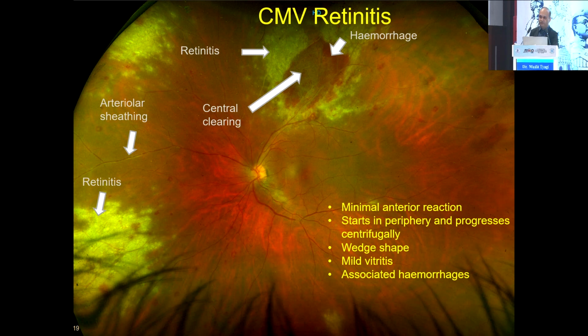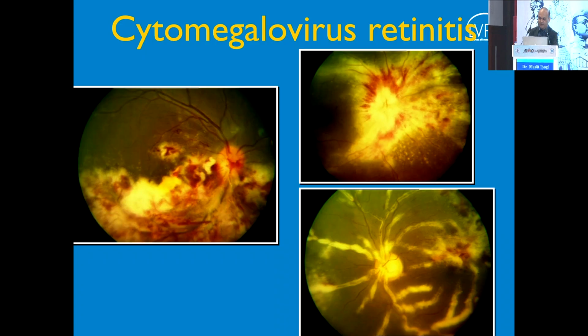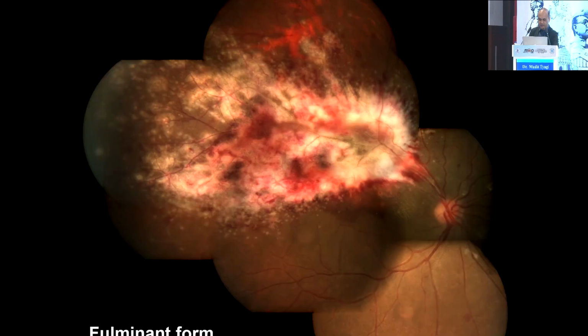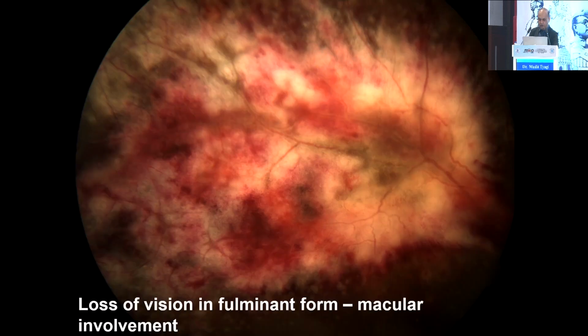And the reason for that is that most of these patients are immunosuppressed and therefore do not have the ability to mount a significant immune response. And therefore, while you may see extensive retinitis lesions, you may not see a significant AC or vitreous inflammation, which you may think should be there otherwise. So CMV retinitis has got its own patterns of appearance, dense retinitis with multiple hemorrhages. And another classic pattern can be what is described as a frosted branch angiitis. So absence or minimal vitritis, you can have a fulminant form over here.